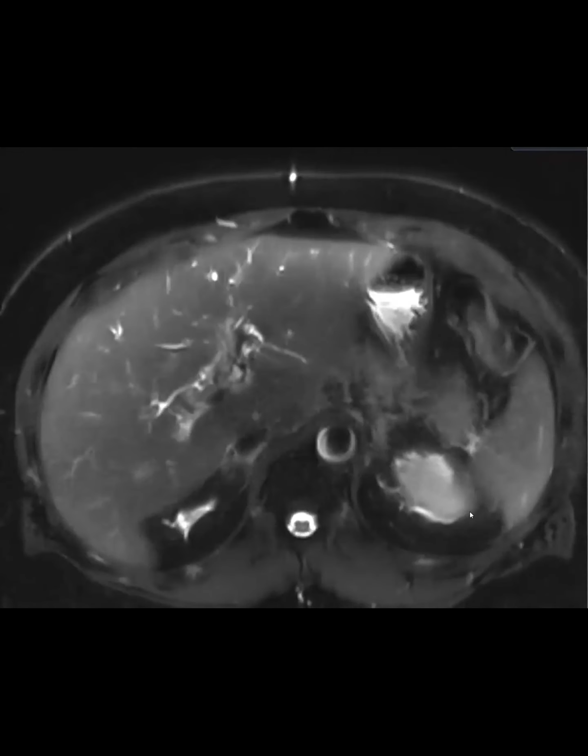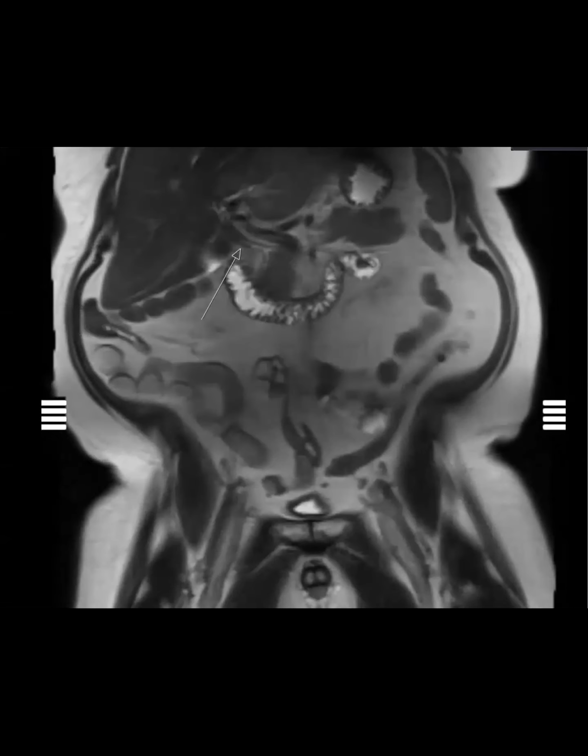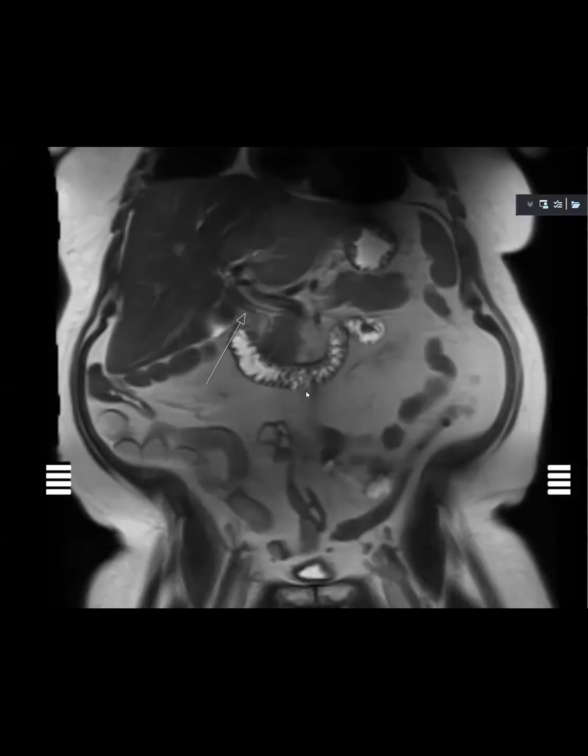Yeah, just a cute case. Great case. Initially they were leaning towards, is there a cholangio? Is there something here? You can even see they were bringing this up, asking why the ducts look this way, but really a cholangio shouldn't cause beading of the ducts. So that's the clue.